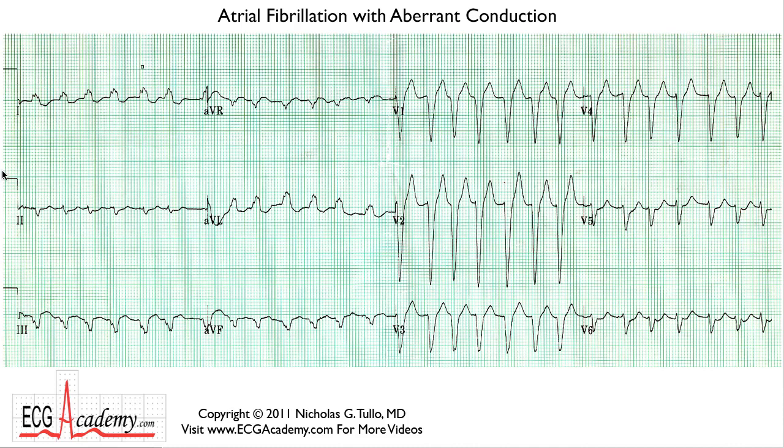Now, this is a cardiogram showing a wide complex tachycardia, or WCT. So that means the QRS is wide, and some people just call it a wide QRS complex tachycardia or a wide complex tachycardia. So when you look at the QRS complexes, they are indeed 120 milliseconds or so in duration. It's not terribly wide, but as you scan across, you can see it's rapid, but there is some irregularity to it. So most of the time, the heart rate is running somewhere around 170 or so beats per minute.